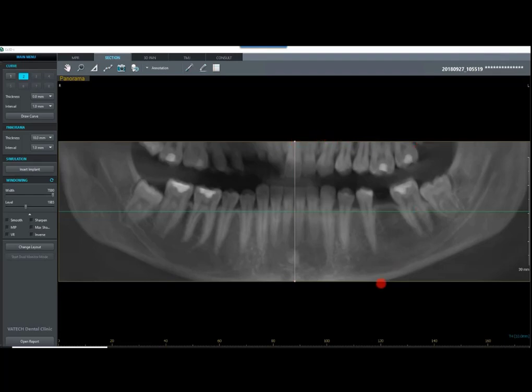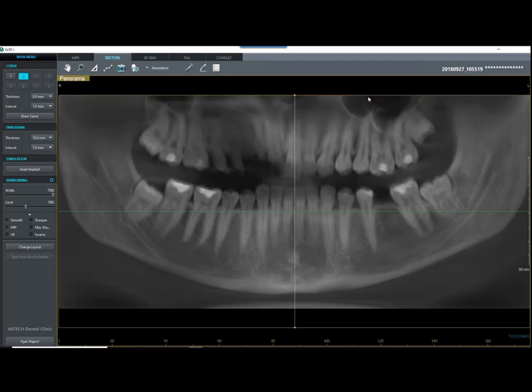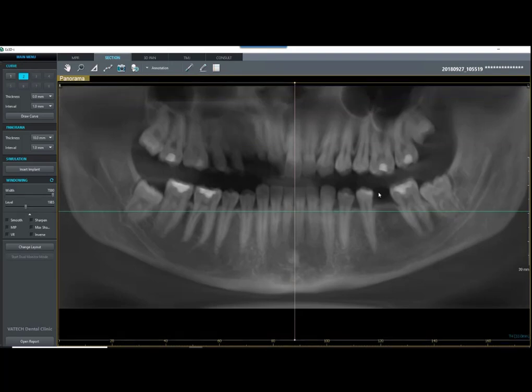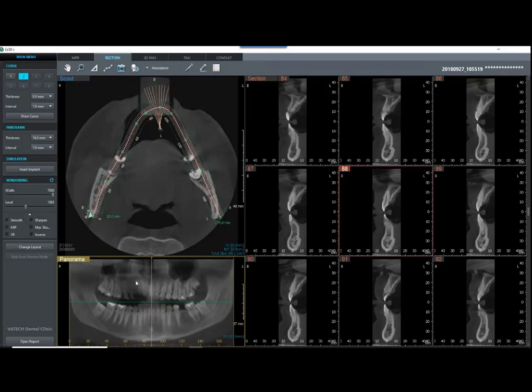So I can grab this yellow line or this yellow line to change my height. And this is going to be the center. So if I come here, I'm going to hover my mouse here and drag, and it's going to open that window up to create our height here. And let's move our green line to go right to the center. And now we can bring this back down a little smaller. And we're going to say that we have a nice recreated pan there.